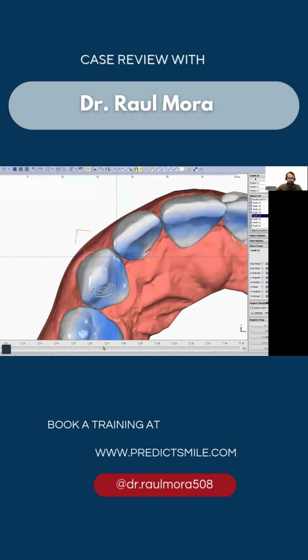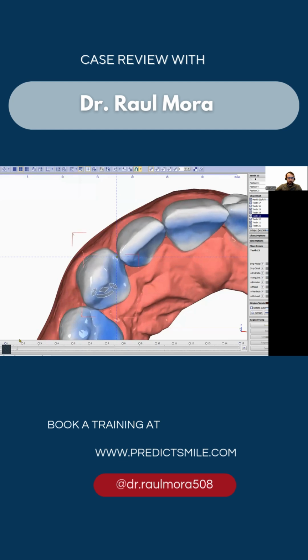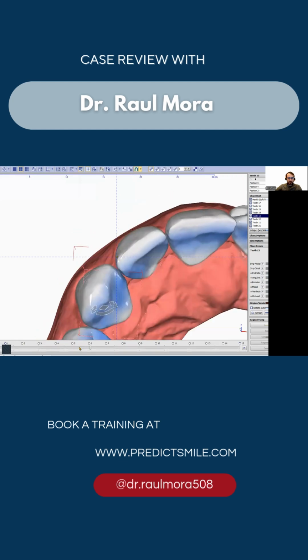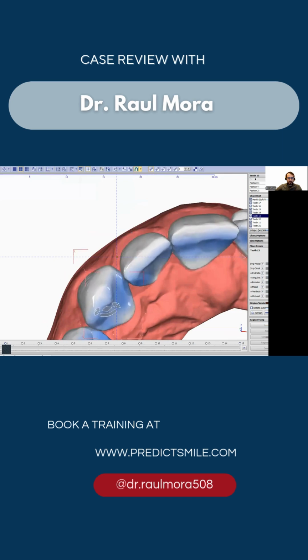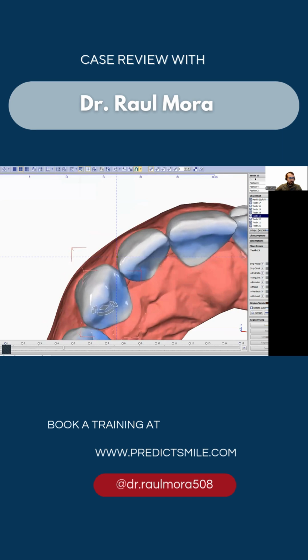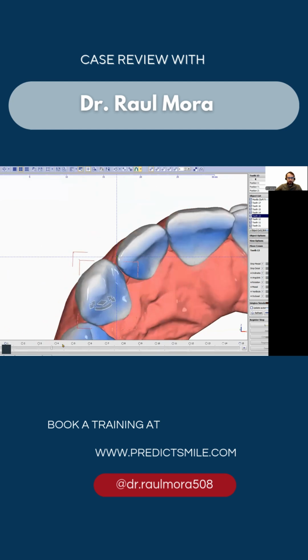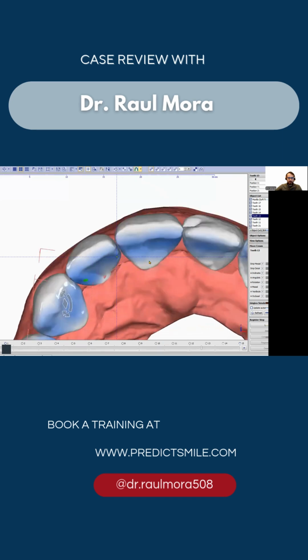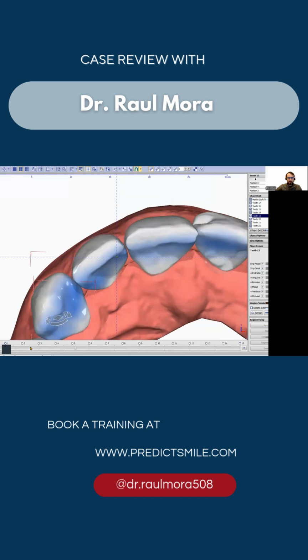And actually, I have to do this. Hold on. No, actually, it has also some rotation, you can see. So in that movement, buccally, I'm going to give, because now the canine goes buccally and then does mesial in with some retraction, which is good. Maybe we can just leave it like that. And let me also fix something here. So now we have the buccal movement of the canine, giving the space for the lateral incisor to derotate, and then the hinge movement with the mesial in for the lateral incisor.